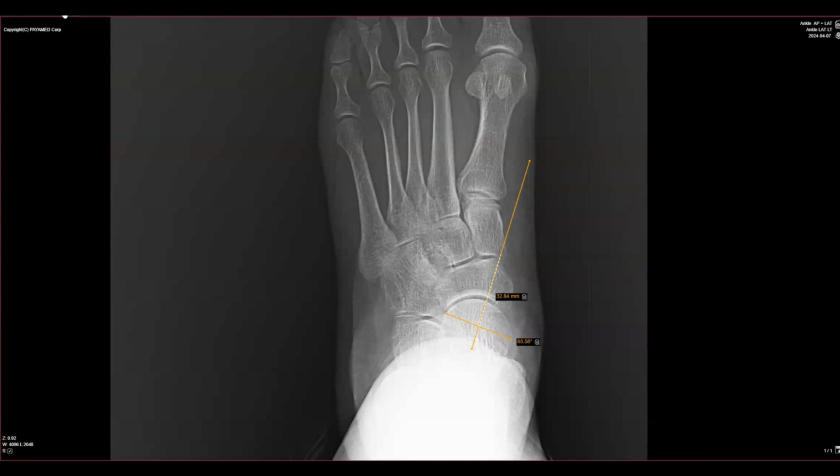We can appreciate the sesamoid axis. If we look at the bisecting the first metatarsal, notice that the tibial sesamoid is approaching into stage 1 position once it gets to 50%, and past midline is a stage 3. So we're beginning to have some sesamoid rotation, which tells us a little bit about the need to pronate or the overpronation biomechanics that might be in this patient.